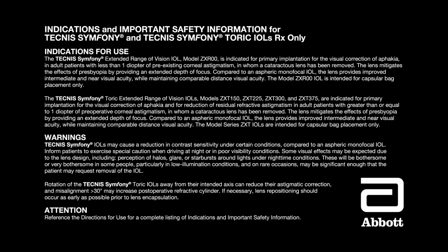The lens mitigates the effects of presbyopia by providing an extended depth of focus. Compared to an aspheric monofocal IOL, the lens provides improved intermediate and near visual acuity while maintaining comparable distance visual acuity. The model series ZXT IOLs are intended for capsular bag placement only.